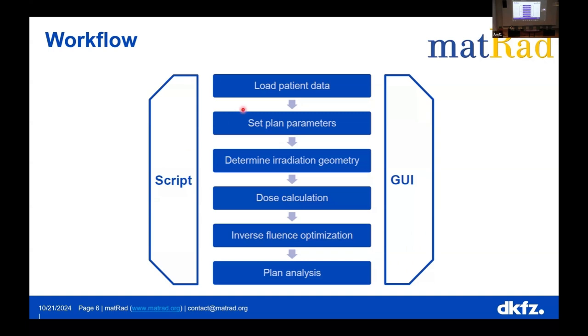But in principle, you can, for example, load and import your patient per script, then set all the plan parameters in the graphical user interface, run a specific dose calculation per script, optimize your plan and go to analysis in the graphical user interface. That's the philosophy of matRad, which allows you to combine a research and educational environment quite nicely, because you can modify every step of the workflow.